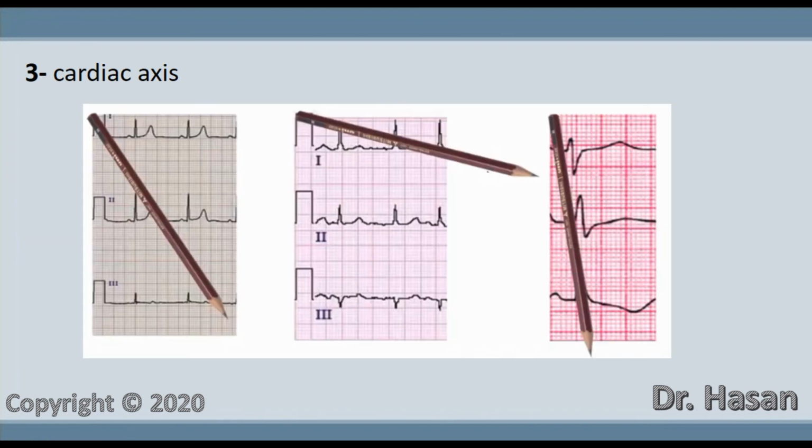Now let's move to the simplest, or in other words, the everyday way of determining the cardiac axis. In the figure below, we see three fragments of an ECG. On the ECG tape, we place an ordinary pencil as follows. The non-pointed side of the pencil is applied in the corner of the ECG tape, and its continuation is superimposed on the R wave in the lead in which it is the highest. You can clearly see how the cardiac axis is located.